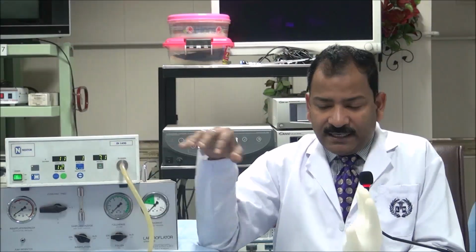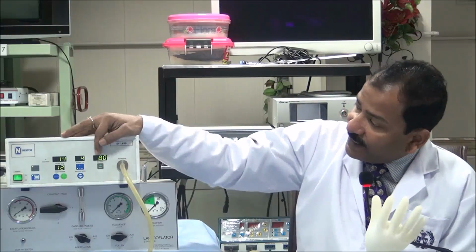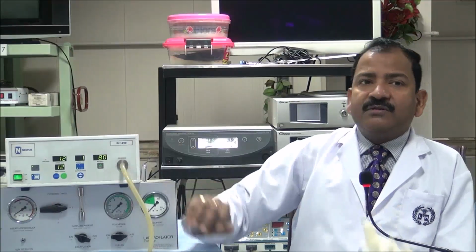Suppose I am doing surgery and one of my cannulas is open and gas is leaking. I cannot hear this sound in the noisy operation theatre. And at the end of the surgery, when I look here, I come to know that I have lost 40 liters of the gas, or I have lost 100 liters of the CO2.